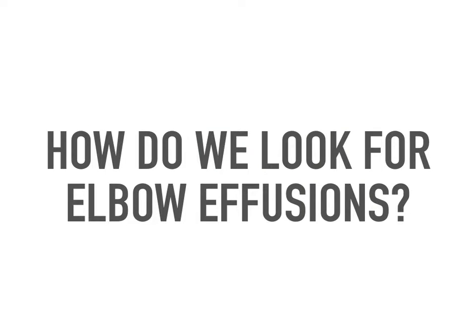So how do we look for elbow effusions, regardless of what's in them? In our patient population, we will mostly be concerned about supracondylar fractures, but we can still see joint effusions with radial head fractures, elbow dislocations, olecranon fractures, and other pathology within the joint space.